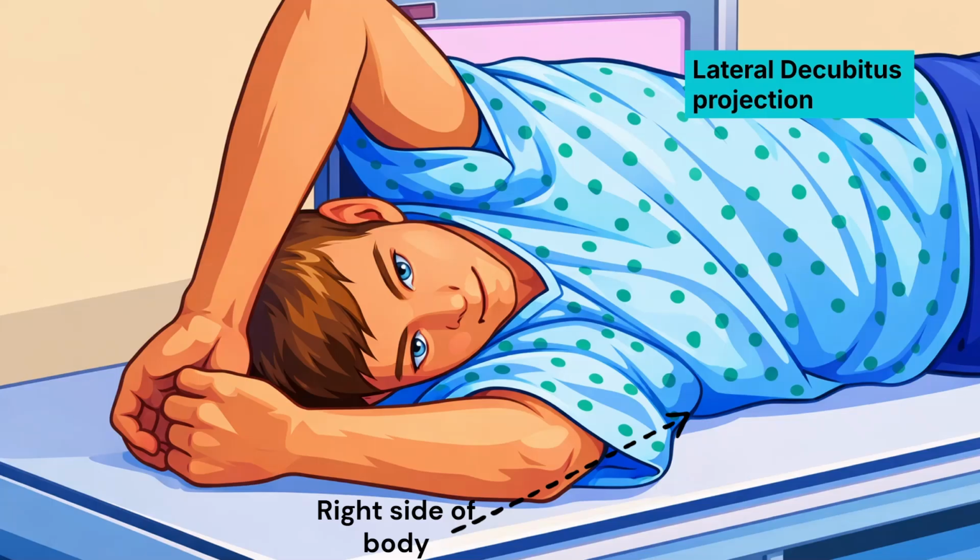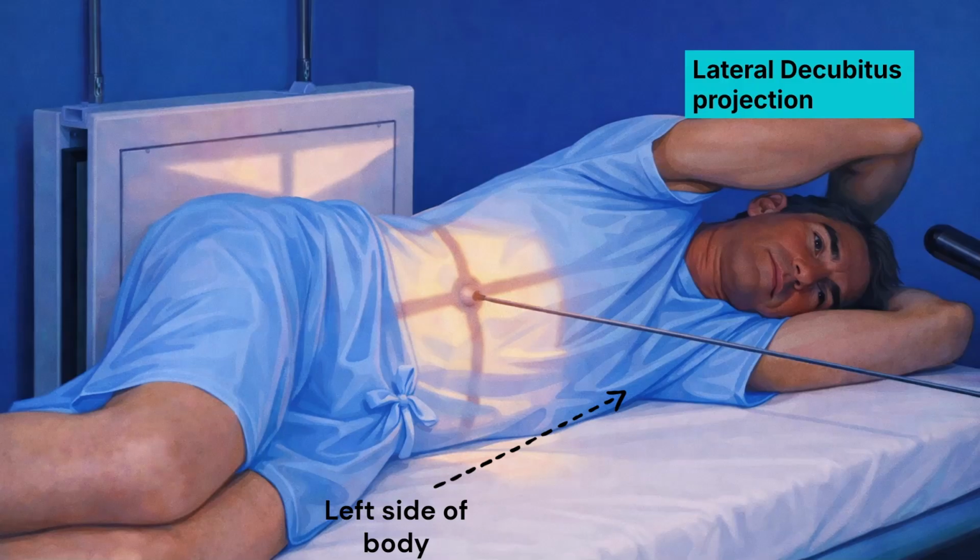Some projections are designed not just to show structure, but to show movement. The lateral decubitus projection is one of them. In this position, the patient lies on their side, and the X-ray beam is directed horizontally to the region of interest. Gravity now plays a role. Air rises. Fluid settles. This allows us to visualize things that depend on movement rather than shape.